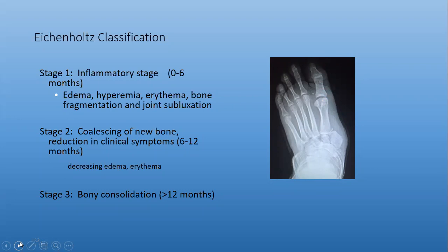Good. So what would you stage this as? For Eichenholtz, I would say, I don't see, maybe there is a lot of sclerosis, but I would say more the first stage, which is deconstruction. Is it deconstruction? What stage is it? Stage one. Stage one? Oh, sorry, development.